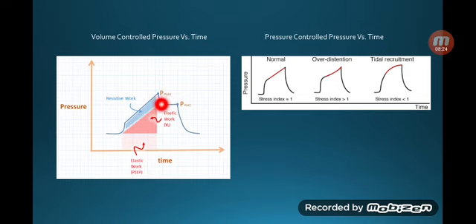While the whole curve, especially from the pressure plateau down to the baseline of the PEEP, because this is basically the PEEP, sorry I didn't say that, is telling you the story about the elastic work, which is the compliance. So this is the compliance, and this is the resistance. And you need to work out what to do to make the curve smoother and get the lung in a better status with every breath.